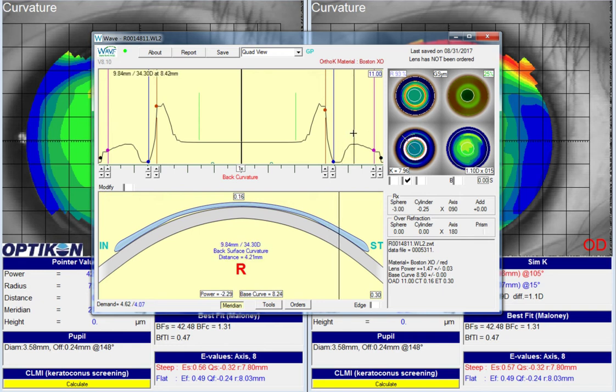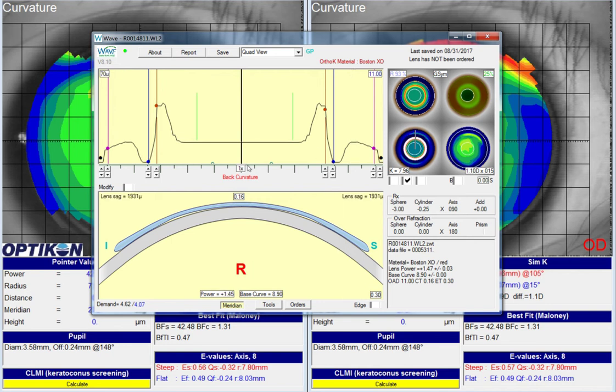So over here we can see that the curvature varies, and in the upper left corner of the yellow window, you can see the dioptric power of the curvature, and it tops out, I think, around 34.50 or thereabouts. So what we want to do is just go into these quadrants and do the same thing. You can see this one's a little bit higher. It's up into the 38. So we're going to lift this up to flatten the lens.